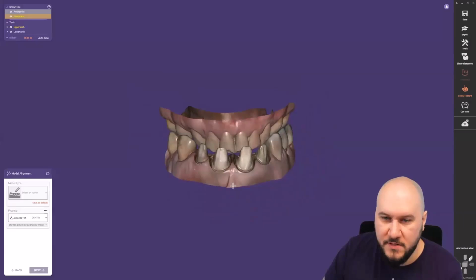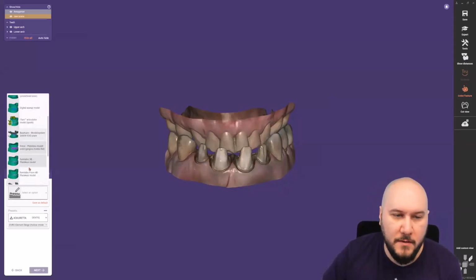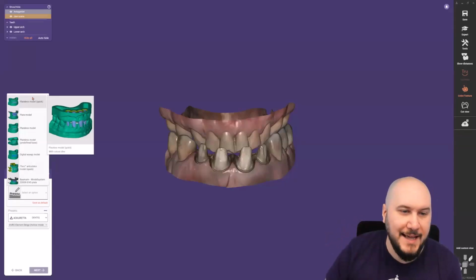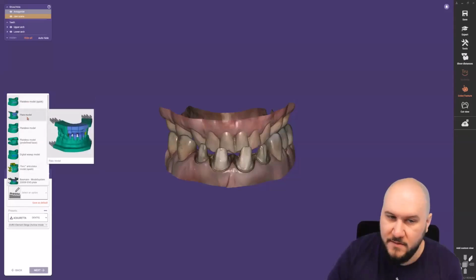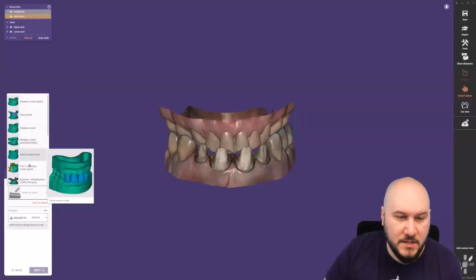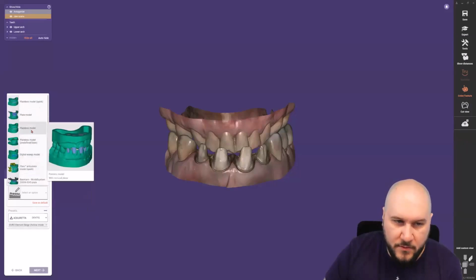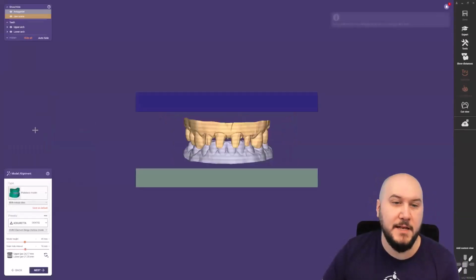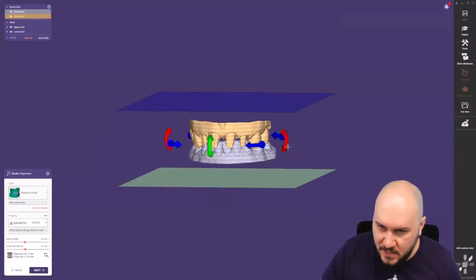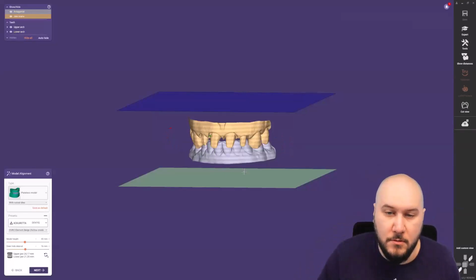And then we can see directly the first thing that came to our mind when we see the new model alignment step, the things that I mentioned in the PowerPoint presentation. Now we can see here directly, we have our pictures available. When you hover with the mouse over it, there is a small picture as a preview and also a bigger one. So we can see which kind of model type you want to work with: plateless model with predefined bases, wax-up models, iTero articulator, Baumann model systems, and so on. Gingiva mask flat. Now with a little bit better overview, I think most of you are using the plateless model design in this case. Everything here is familiar. Pushing the control key, you can also set up the different positions of your model types and a situation to set the model in your height or your direction.